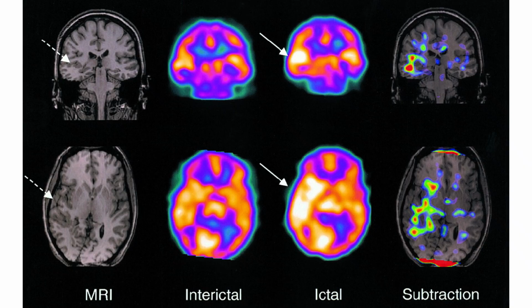This one is another one, and this shows it's a little bit higher, more to the side, closer to your parietal lobes. But you see it spans that area there. This case I wanted to show you because it demonstrates the close correlation with MRI and how beneficial they can be. This particular one is using something called a subtraction method, and sometimes techs do it. A lot of times physicians can do it on their software if they feel like they need it to help them read the test.